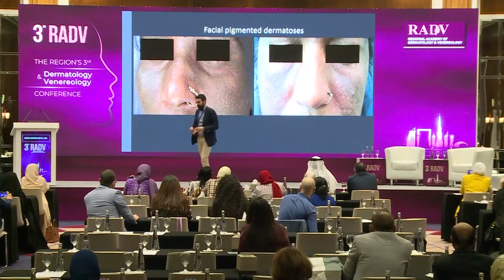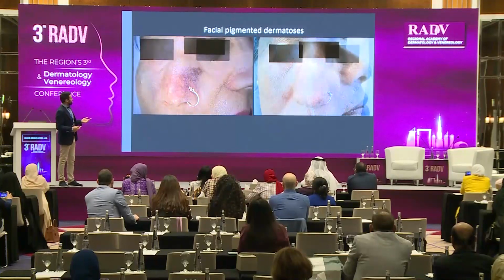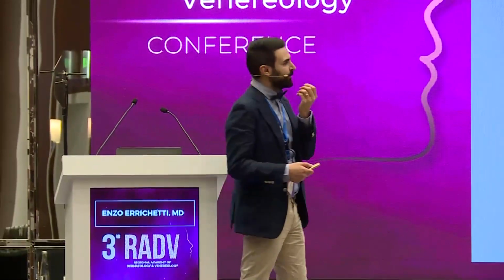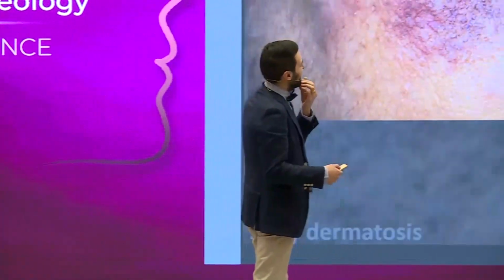Melasma. To me, everything looks like melasma. And here it's easier. Okay, let's take a look at the dermoscopic clues of these conditions.